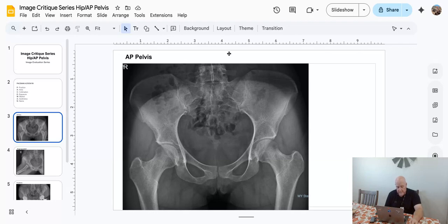Area, we've included everything that we need to include. Okay, we've got the iliac crest right here, or the crest of the ilium, which is this area right here. We've got the actual ilium, which is the paddle of the pelvis. Now we've got the iliac crest, which is this area right here. Okay, and then we go down and you'll note on both sides that it takes an internal turn right there.